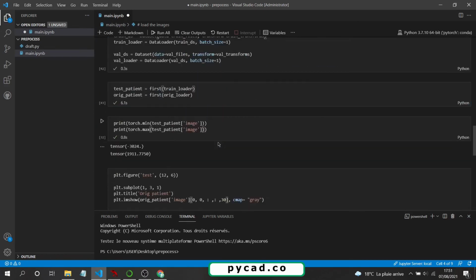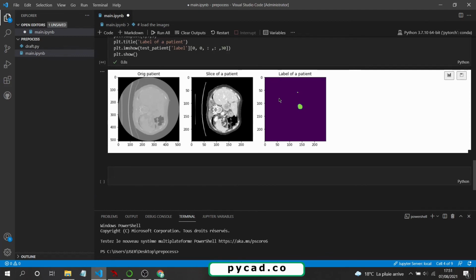Why do we need to do this? Because here, if it goes searching for the region of interest or for the foreground from the label, it will take only this region, because this is the only region that contains something. The other one is all zeros, and zeros is black background. But we don't need that. We need it to take the region of interest or the foreground from the image. So we need to say that starting from the image, do this crop.